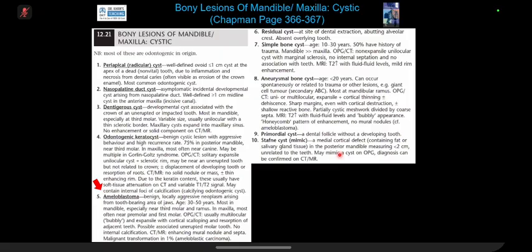They appear cystic, for example radicular cyst, nasopalatine duct cyst, and dentigerous cyst, which are usually related to the tooth. Ameloblastoma can appear as cystic on a CT scan or, let's say, an OPG, but it is of course a solid tumor. The key concept is that you did ask for Hounsfield units, which was fine, and you did ask for contrast, which was fine. I showed you an MR, and you have to look for anything solid.